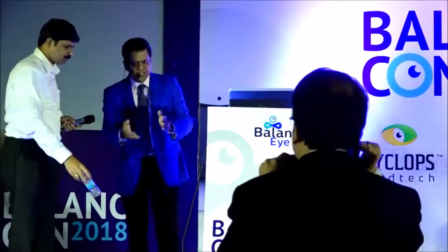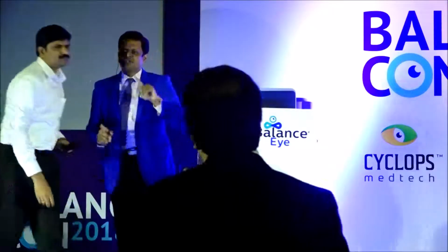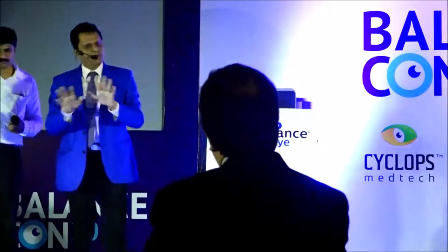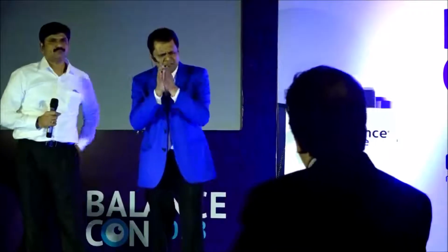Go ahead. Okay, shall I? No, I thought there's something else that you would like to say. I'll come back. Given a choice, it should be 3T. Because the resolution is much better and we're looking at very, very fine structures.